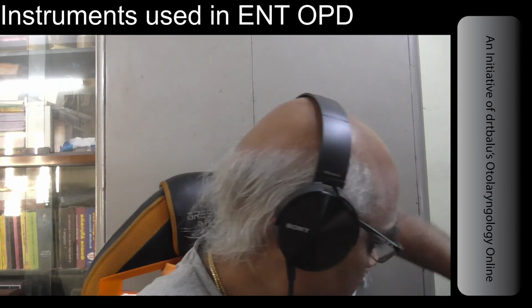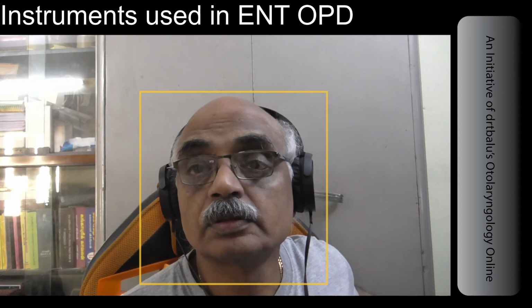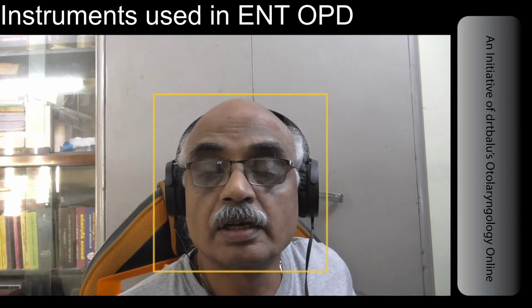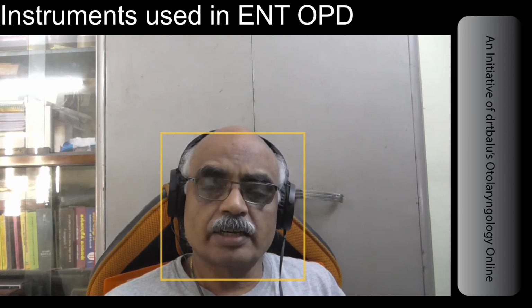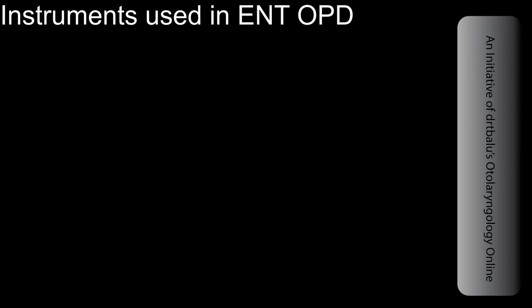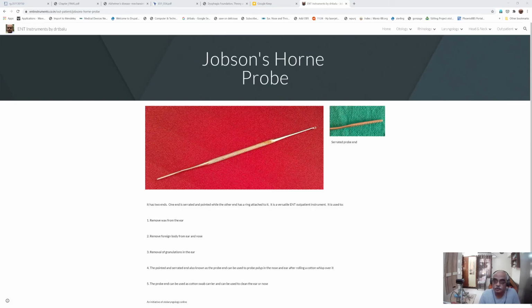I think I have completed the majority of the OPD instruments. One or two instruments I could have missed, so I'll be showing pictures of those instruments.